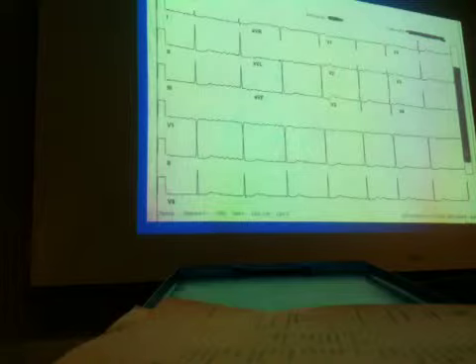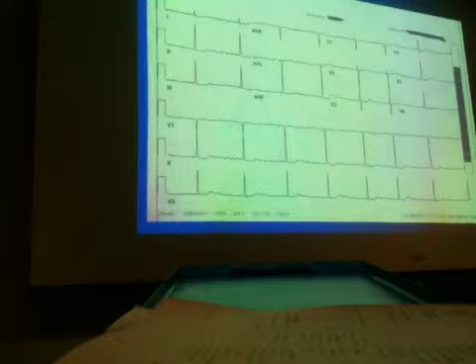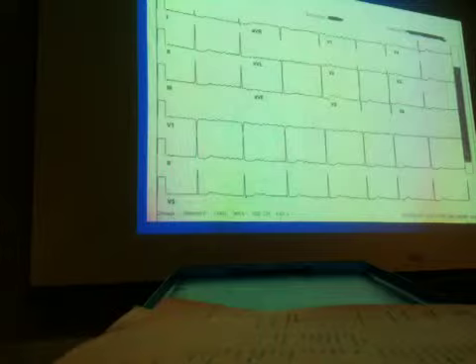So when you receive a patient on the floor, their baseline EKG may be this, and you may say, you have a history of atrial fibrillation. You see them on Cardizem or a beta blocker. This is a little bit tougher to see on here, but if you had it in front of you, you could actually measure it out. You see that it's irregular.